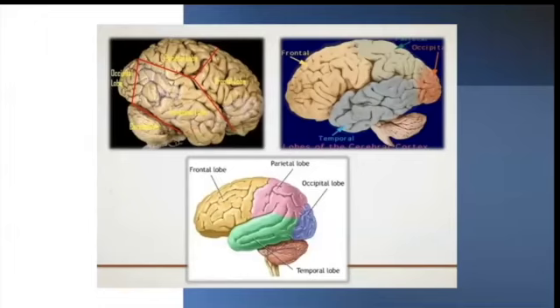Now, since we covered some of the most important indications for head CTs, I think it is proper that before we delve into the subject, we review some of the basic anatomy before we delve into the fascinating world of brain CT imaging. So initially, we need to identify the four main lobes from a lateral view. So we need to know the occipital, parietal, temporal, and frontal lobes. And they are well indicated here by the color scheming in these images.